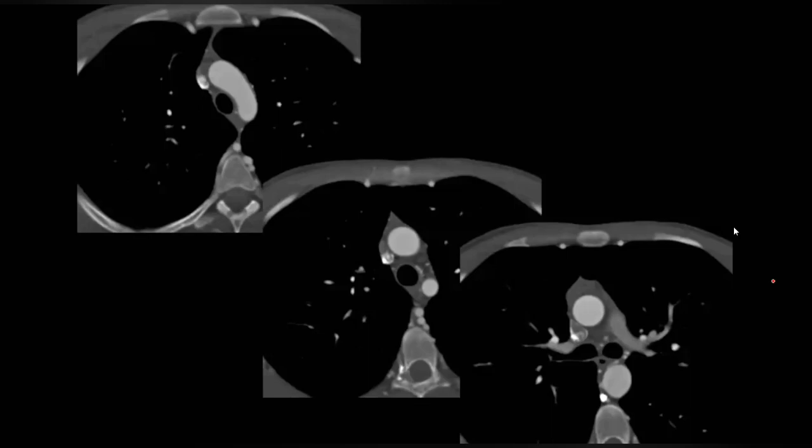So the stenosis here is obvious. You see narrowing of the descending aorta, and poststenotic dilatation, leading to the figure of three configuration. And you will see how the intercostal arteries are big, and the internal mammary arteries are big as well. Prominent, okay?